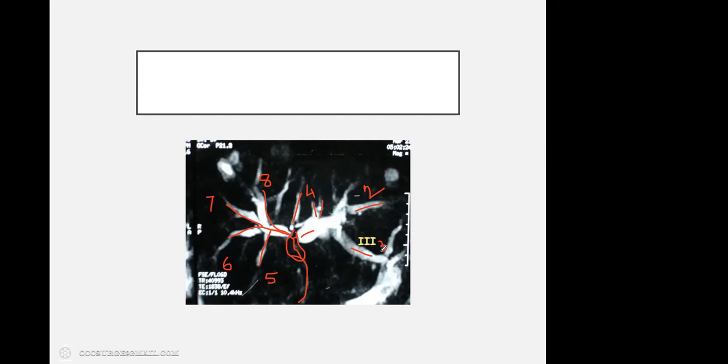You cannot see liver, you cannot see any other structures, only the bile ducts which are dilated, and this is the stomach which contains fluid. Again, it contains fluid, that's why you can see the bright shadow of the stomach. So here this sequence is meant only to see the biliary tree and nothing else. So here we can see the exact location of obstruction, the cause of obstruction, whether it is neoplastic or it is due to choledocholithiasis or something else, or any inflammatory lesion which is causing that, we can see and figure out in this T2 weighted sequence, which is called Haste sequence.